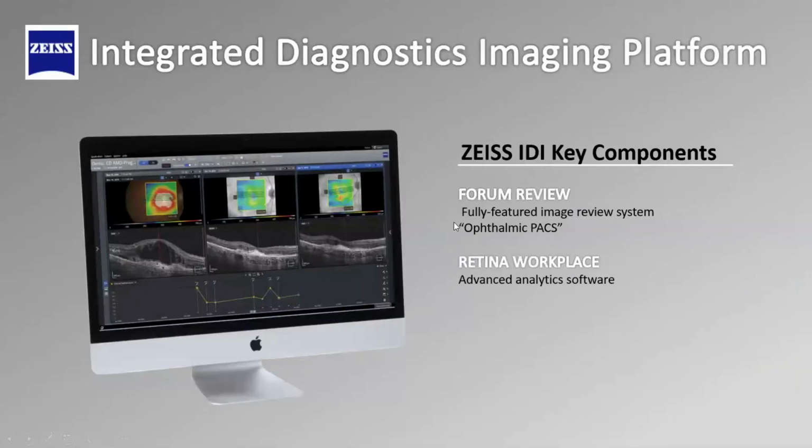In terms of PACS systems, I think the Zeiss integrated diagnostic imaging platform is certainly the foremost retina PACS on the market today, and that's what we'll be digging into further during the talk. The Zeiss IDI consists of two key components. There's the backbone, which is the Forum review software, which is basically your ophthalmic PACS, a fully featured image review system, and it has an add-on, the Retina Workplace, which is an advanced retinal analytics software.